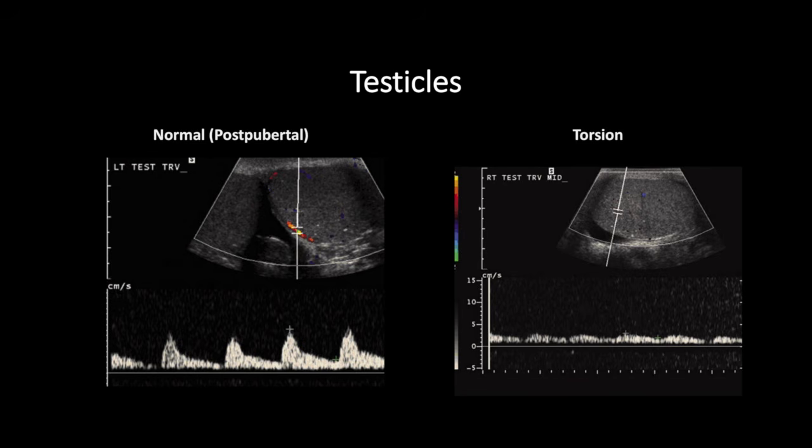Okay, another application that we're not going to show you here, in epididymitis orchitis, obviously you're going to get increased Doppler flow on the color. But specifically speaking of the waveform, when you have orchitis and you look at the waveform itself, the one clinical thing to take away is that a high resistance waveform or a very high resistance waveform can be a negative prognostic indicator.